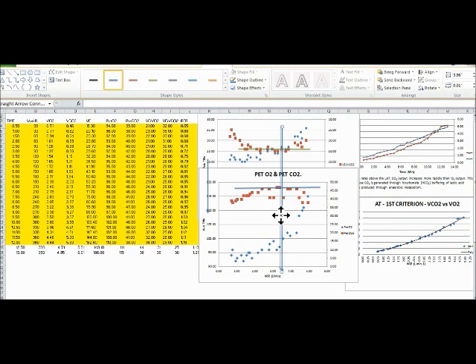I would say it's right about there. Okay, so this is the line to mark the lack of change in VeVCO2. This is the line to mark the lack of change in PET-CO2. And we're going to draw our vertical line where PET-O2 and VeVO2 begin to increase in those spots. Okay, so that's about where we're at.